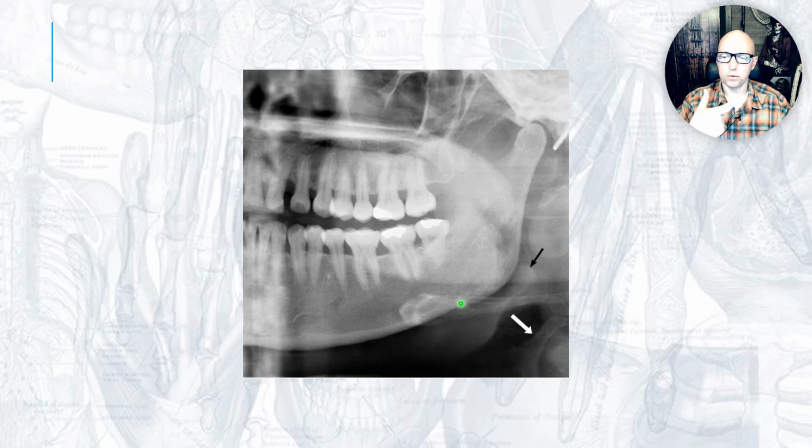It's kind of a horseshoe. It seems like it curves up a little bit in the back. You have in the center the large portion of it, the body of the hyoid, and then those arms that project backward are the greater cornua, the greater horns. And so this is one of the horns of the hyoid bone.